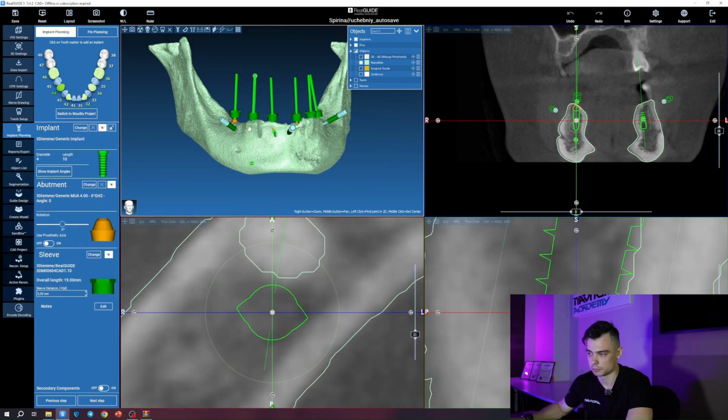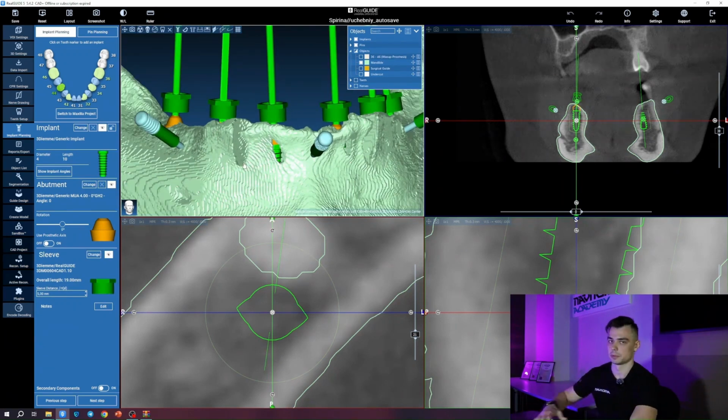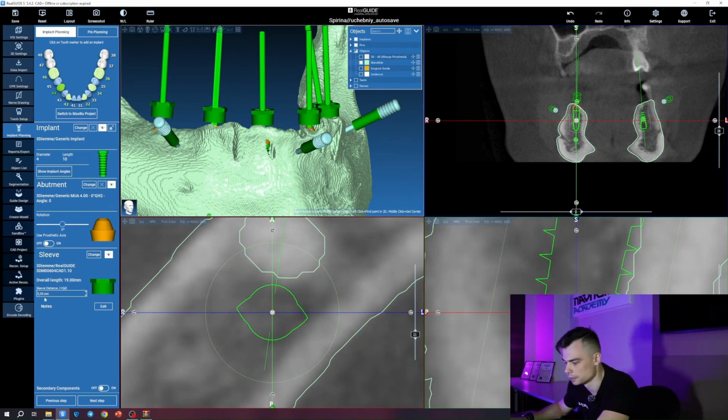Very often bone-supported guides don't fit properly for this reason. The first thing we need to do is slightly raise the sleeves above the bone surface. Here in the area of 4 and 6, everything is fine. Here I would raise it by about 3 millimeters. Wait, no. Actually by 8, because we're adding a 3 millimeter offset.